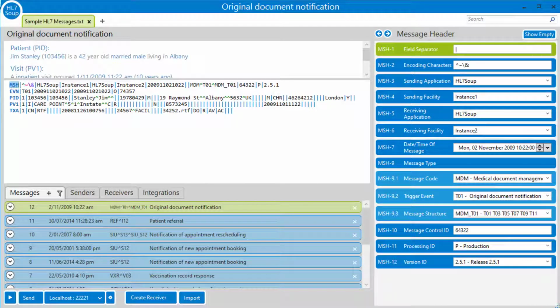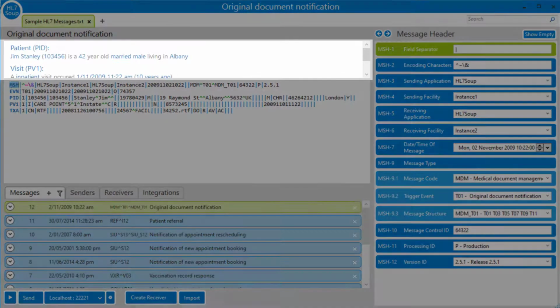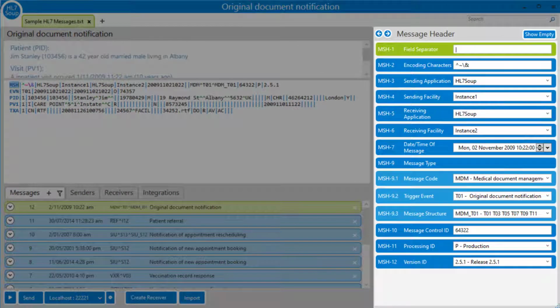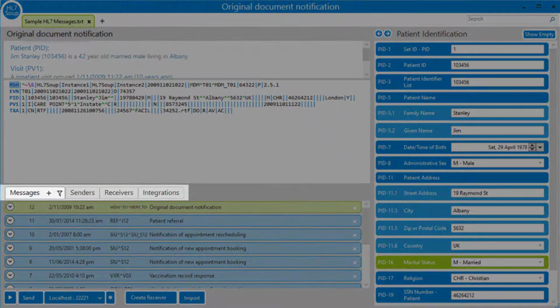What do we see here? Well, at the center of things is an editable HL7 message. This is the current message we are focused on, and everything around us is here to help work with that. This is the message type. Here is a human readable interpretation of the message, and here is the segment grid, looking at the details of the currently selected line. These are all linked together so that clicking or changing the values navigates and updates between the three views. Here we have some tabs that provide additional features.